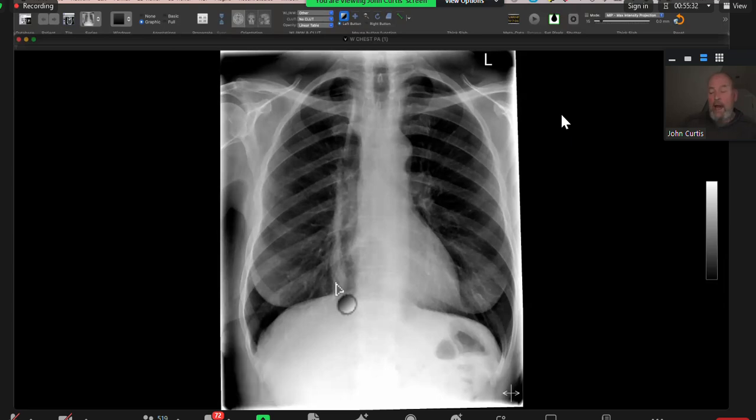Okay. And the other thing to note, whenever you look at achalasia or gastric pull-up in the exam, tell the examiner that there isn't any evidence of aspiration pneumonia. Or if there is, tell them that there is.